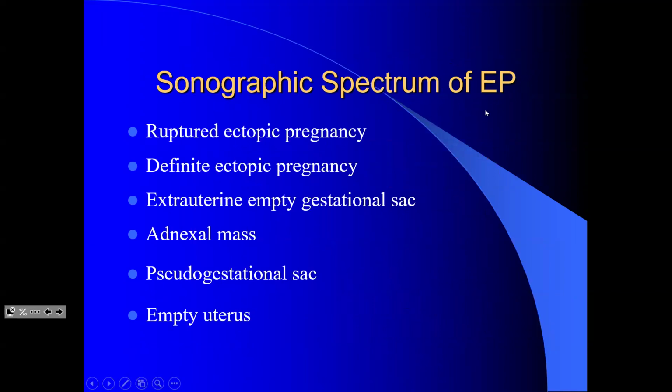So with ectopic pregnancy, what you can see is a ruptured ectopic. Sometimes, since it's implanted in the fallopian tube, and the fallopian tube is a very linear, small structure, as the fetus grows, it can rupture this tube, and they present with rupture and obviously bleeding, and then it becomes an emergency to operate immediately.